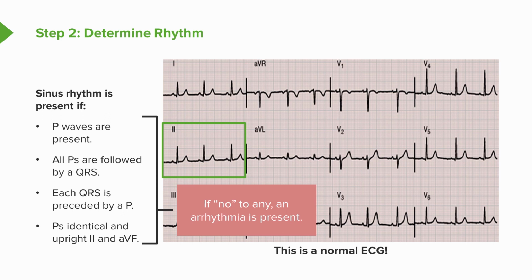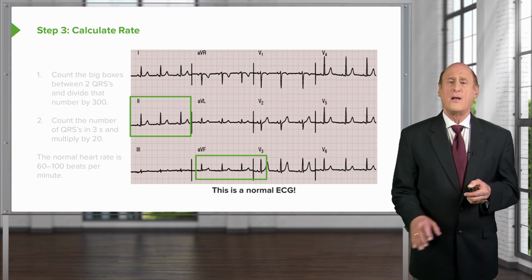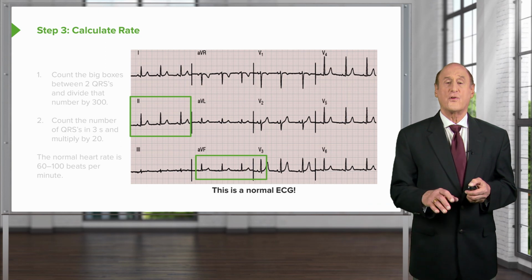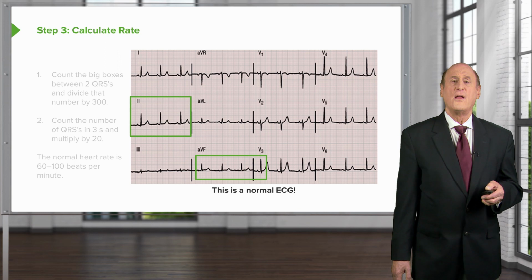And as I said, we're going to have whole lectures on the arrhythmias later. So right now we're just worrying about the normal. Also, you notice how nicely the QRSs progress. In fact, that whole strip along the bottom, even though they're different leads, it's continuous. So you're actually seeing one set of P waves after another.